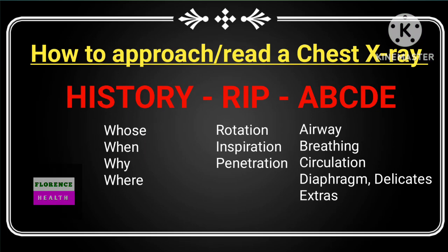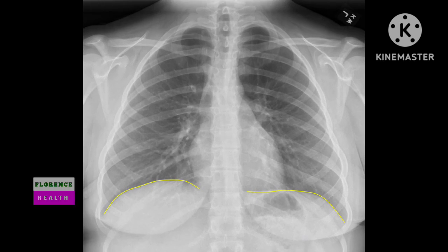Now let's discuss I, that is inspiration. Is your X-ray plate an inspiratory film or an expiratory film? If it is an expiratory one, ask for a fresh one. Let's discuss how to differentiate between an inspiratory film and an expiratory film.